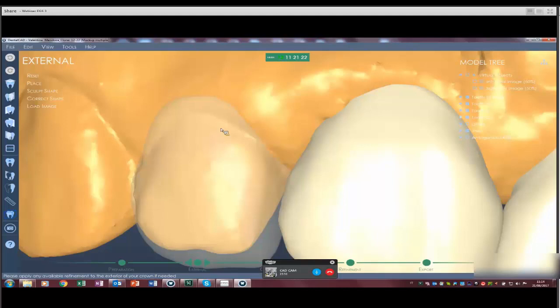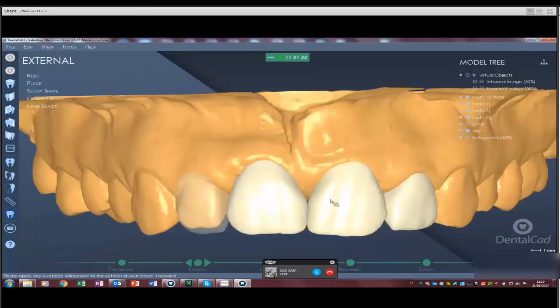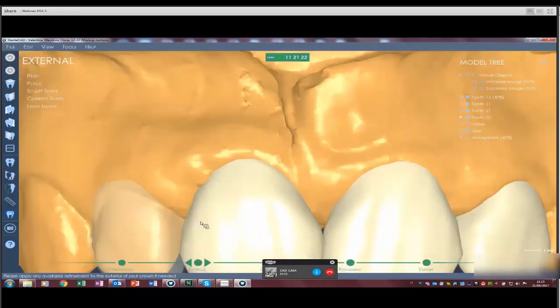And what are the benefits that we can obtain from this free design? For example, we can print this kind of prototype, this kind of mock-up, and use it as a guide for laser surgery. Let's assume that our aim is to increase the height of the gingival edge. We print this mock-up, and with the laser, we do in this way. So we will have removed all this gum, this part of the gum.